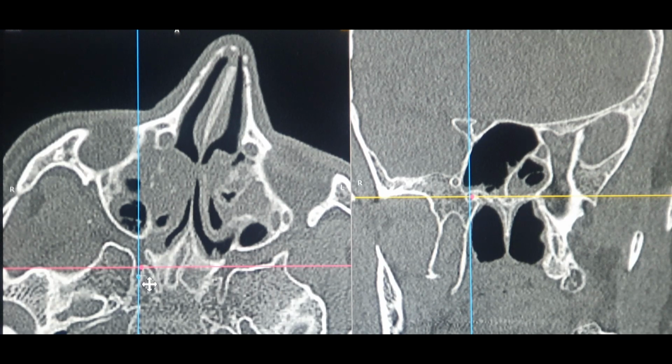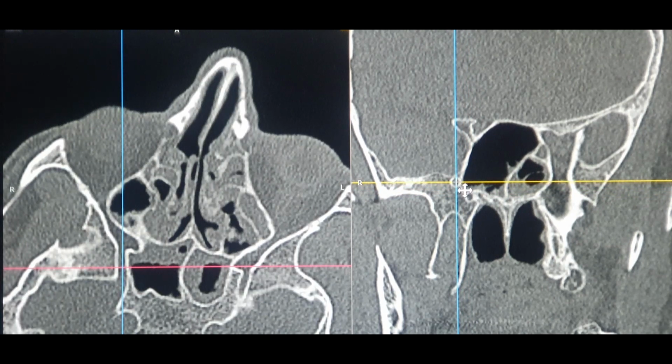Now, one of the doctors asked me a question about this on Facebook, that he had an exam for the AIIMS, and he was asked a question about the anatomical landmark for ICA in anterior skull base surgery. So the answer should be, I think, the Vidian canal and the Vidian nerve. You can see the Vidian nerve, and then you have the foramen rotundum right here for the maxillary nerve.